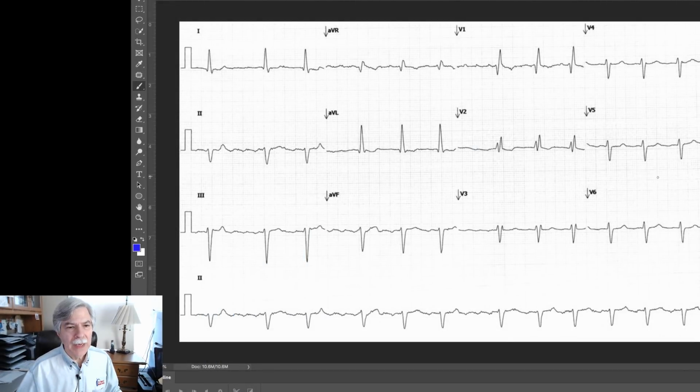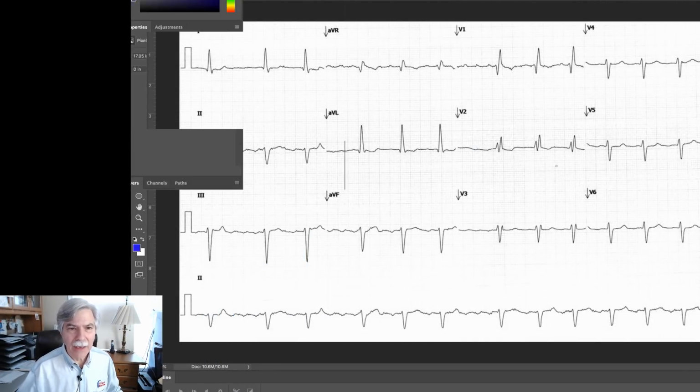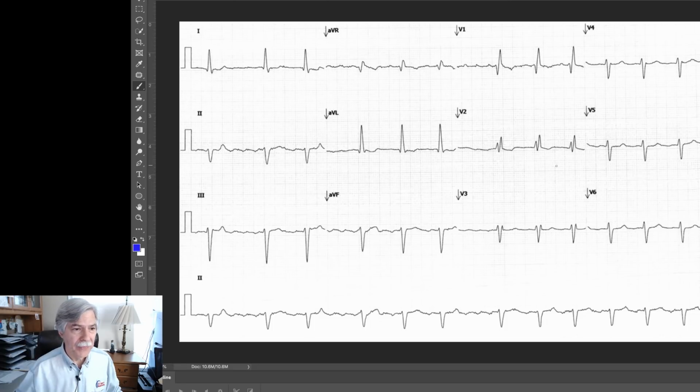Okay, so here's the ECG that was obtained in the doctor's office. And if you glance at the whole thing, you can see it does appear to be irregular. In fact, you have some long intervals and short and long and short, and there's sort of no pattern to it. So it's irregularly irregular. And in addition, if you notice, there is an RSR prime in V2 and an R prime in V1 with a deep S wave in the lateral leads. So there's a right bundle branch block.